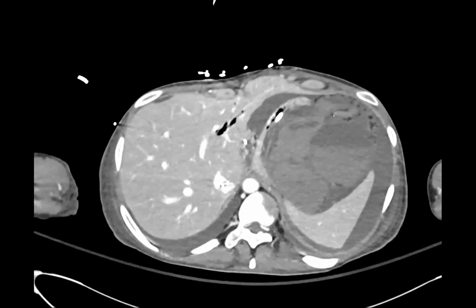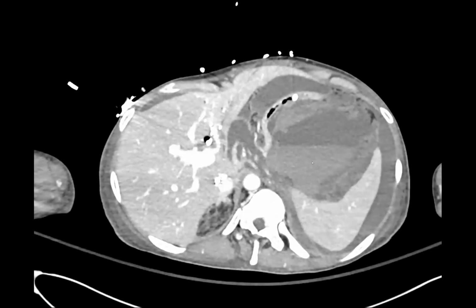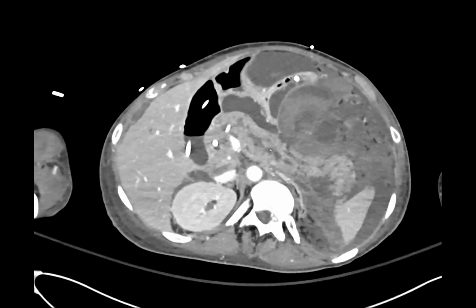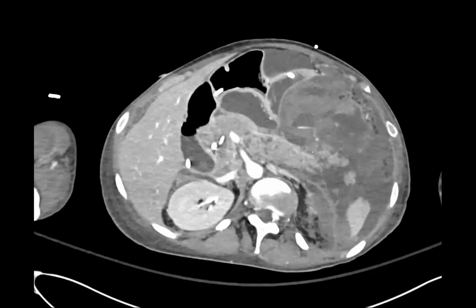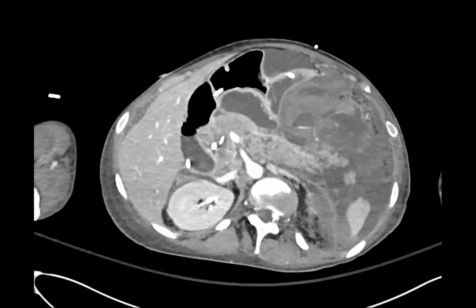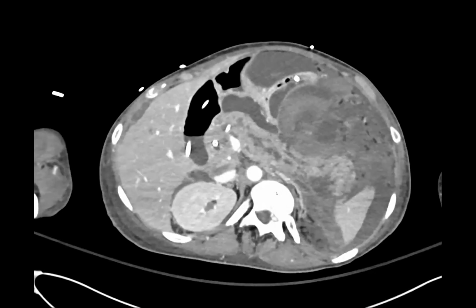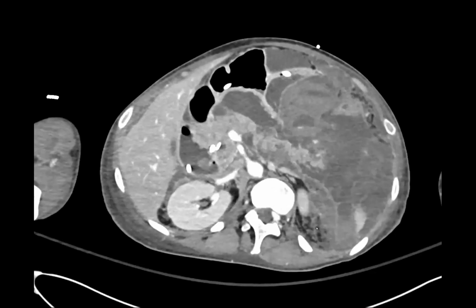So we're now rewinding two days. We have very active hemorrhage with a hematocrit level, which is usually a sign of active hemorrhage, with two different levels here. And then we can see the pancreas, the pancreatic duct, but one of the branches of the splenic artery was here actively extravasating. So they went in emergently and embolized the splenic artery as well as branches of the pancreas. Generally we don't like to do that. That will cause pancreatitis, that will kill off your pancreas. You could become insulin dependent. But because it was a very acute case, that's what they had to do.